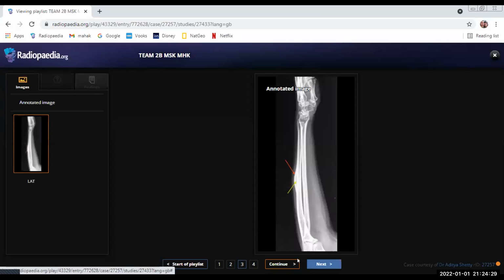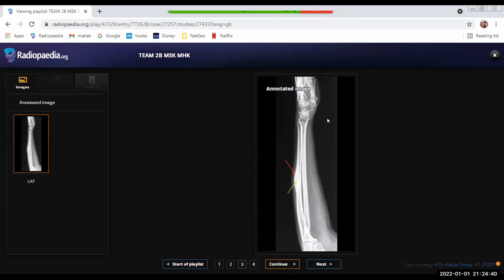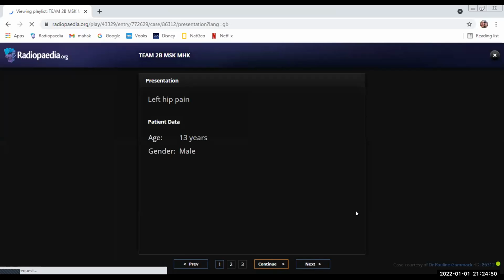Okay, you can go to the next case. Oh, next case? Yes. Okay. I'm sorry. I think you'll have to take me to the next case because my own screen is getting obscured by my screen. Okay. Let's see. Okay, 13-year-old male.